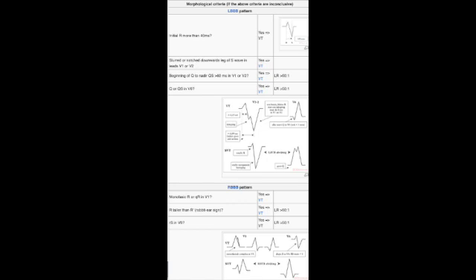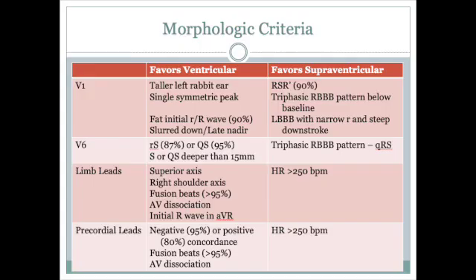And this is fairly complex, so what I've done is take this and work it back through this chart. This is what I use to teach paramedic students about the differentiation of wide complex tachs. One of the things to understand about this chart that's going to be really important is that there are a whole lot of waffle words on here, and B, anything not on the list doesn't help you.